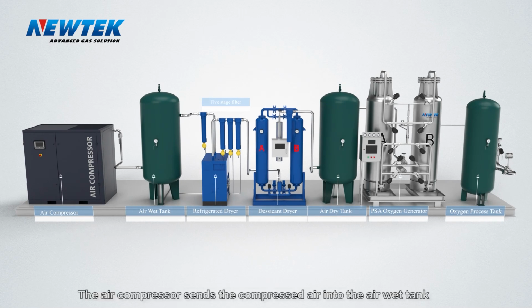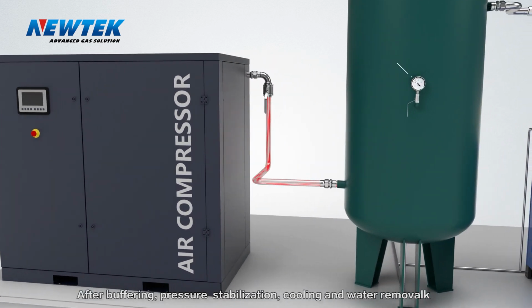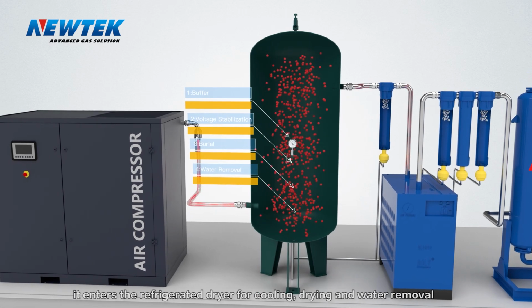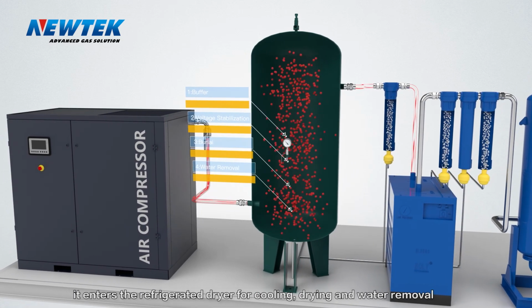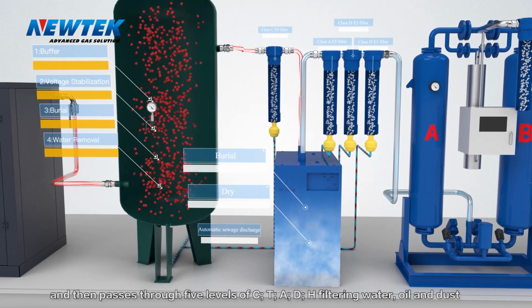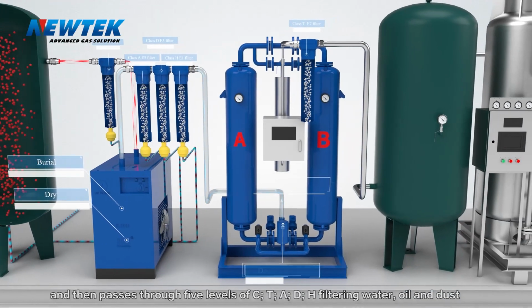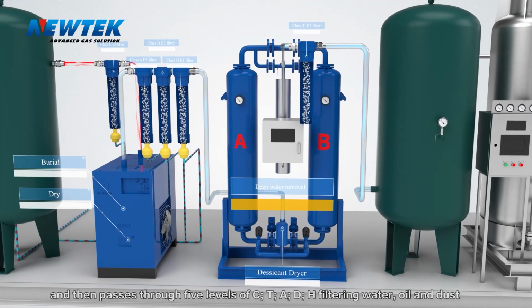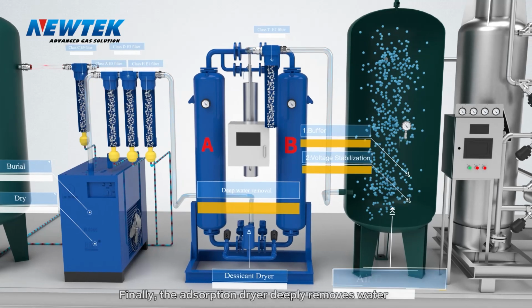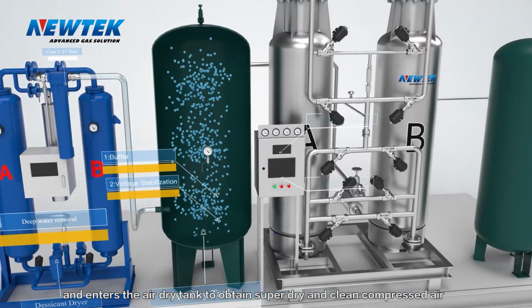The air compressor sends the compressed air into the air wet tank. After buffering, pressure stabilization, cooling and water removal, it enters the refrigerated dryer for cooling, drying and water removal, and then passes through 5 levels of C, T, A, D, H filters, filtering water, oil and dust. Finally, the adsorption dryer deeply removes water, and super dry and clean compressed air enters the air dry tank.